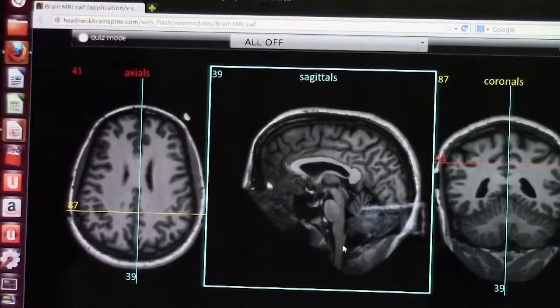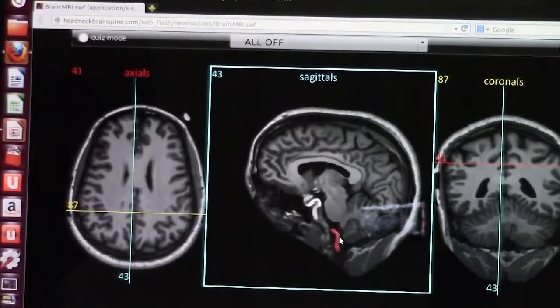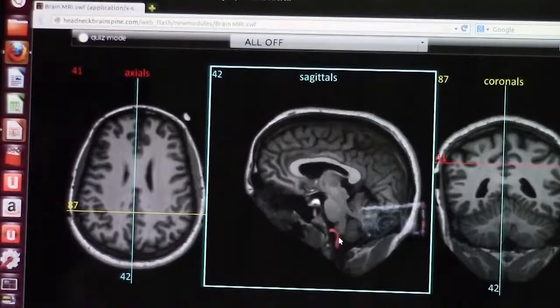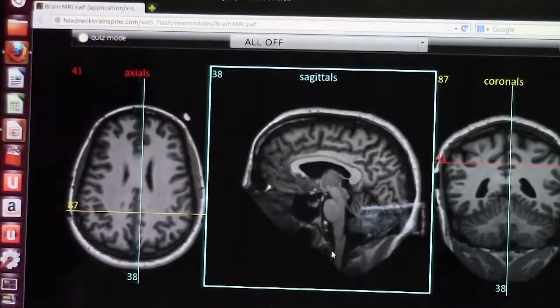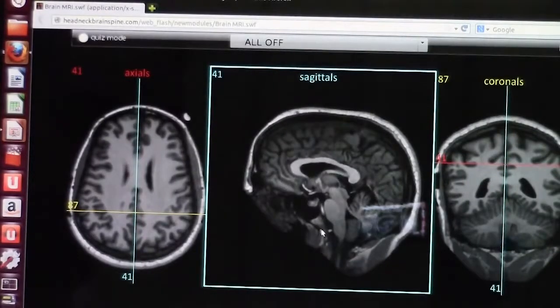spinal cord. Another key structure to look at in the case of sagittal T1 is the clivus, as you see here. This is the clivus. It's very important to look at it, as a certain tumor like a clivus chordoma can be seen here. This is the sella turcica, and here you see the pituitary gland, and usually the posterior pituitary would look bright normally in T1, which is the posterior part of the pituitary gland.